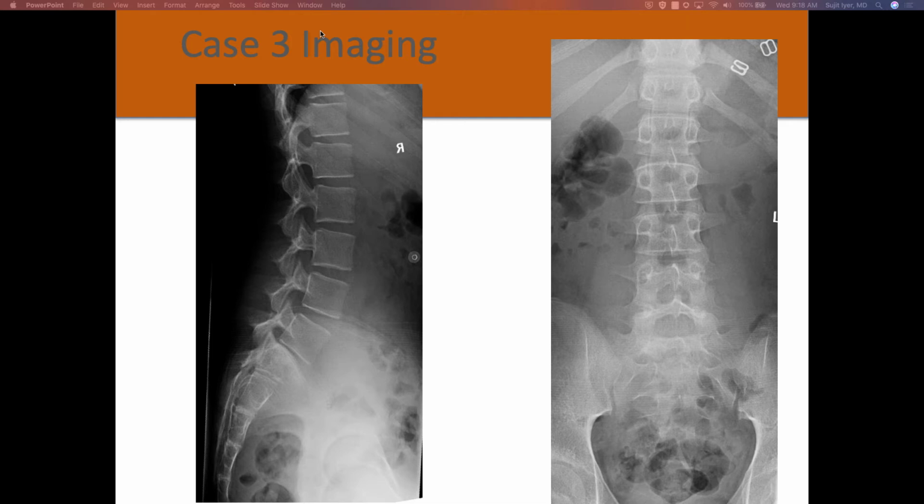Well, that's exactly right. Again, what I try to do, I go up from the top, looking at the vertebral bodies, the disc, vertebral body, disc, vertebral body, disc, and then down here we see this vertebral body loses its normal structure. You see the anterior margin of the vertebral body here, and here it's all destroyed, and it's loss of height, and so suggests some sort of infiltrating process involving the L5 vertebral body. So the next step would be an MRI to look at this area.